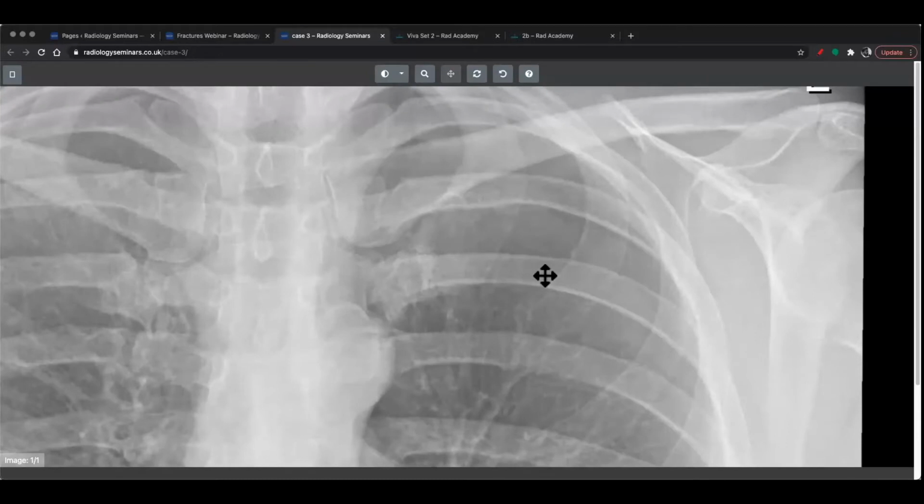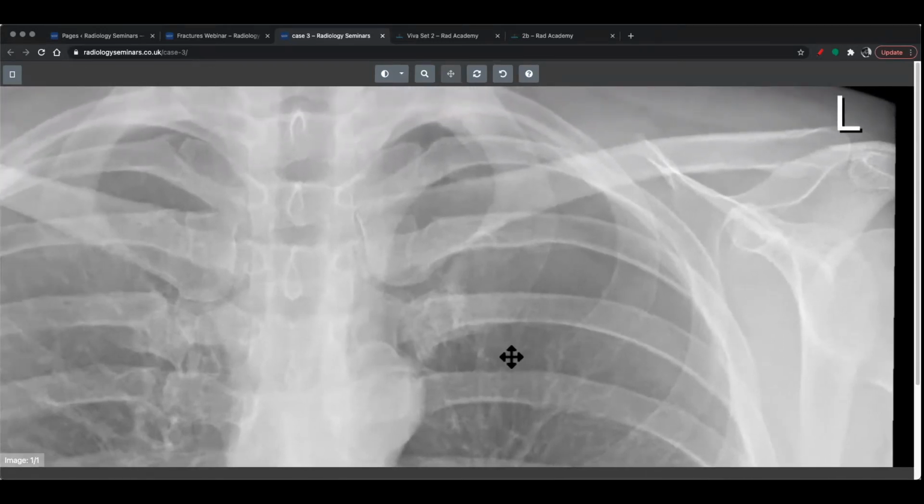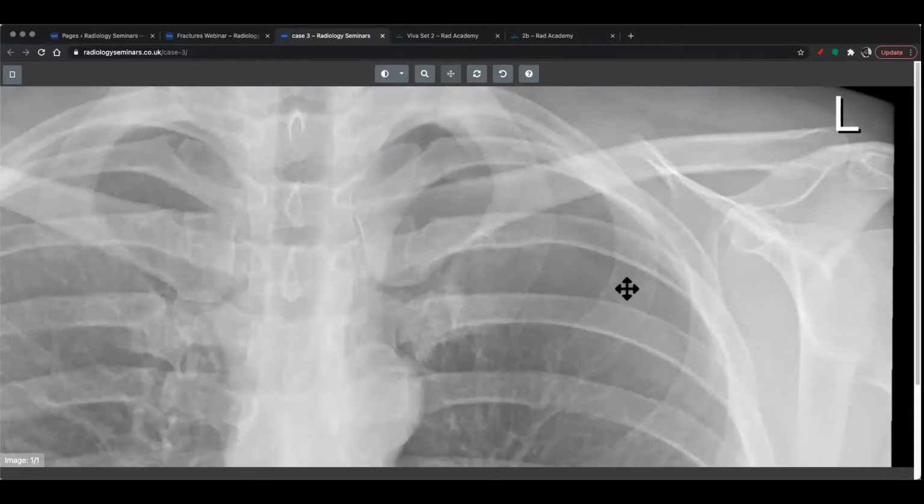So if this is a pneumothorax, we should not have the line veer off anywhere else, but more importantly, we shouldn't have any lung markings beyond the line that we think is a pneumothorax. Now, I know people throw around "lung markings", but what does that actually mean? If you look a bit closer, you can actually see the sort of streaky bits within the lung. Those are the airways and the rest of it. That's what gives you the lung parenchymal appearances. But when you go beyond this line over here, you can't see those lung appearances at all.